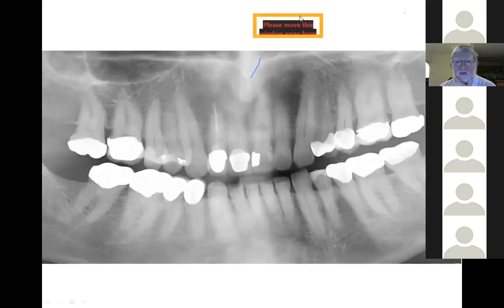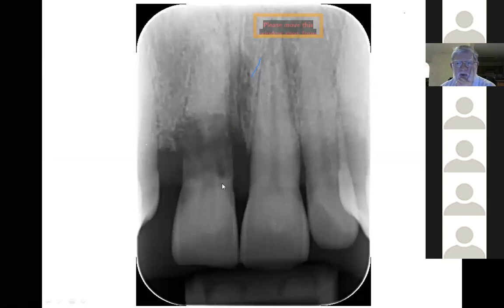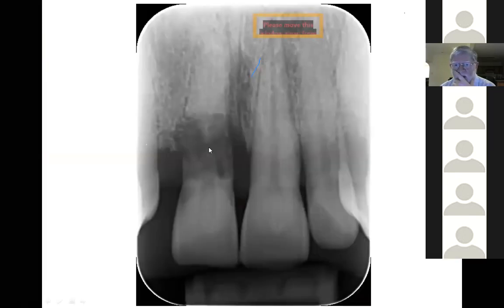And that's the same patient on the OPG. Same thing here, discolored tooth, incidental finding, he's not complaining about anything, and we take this and wow, look at that. I'm surprised he hasn't complained of anything. I'm surprised it's still in his mouth looking at that.